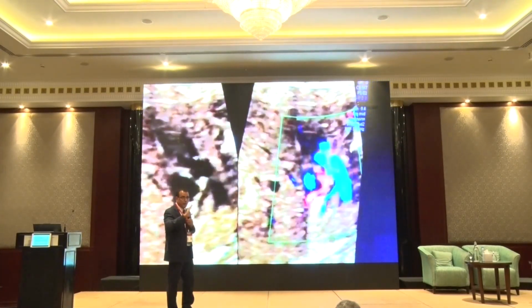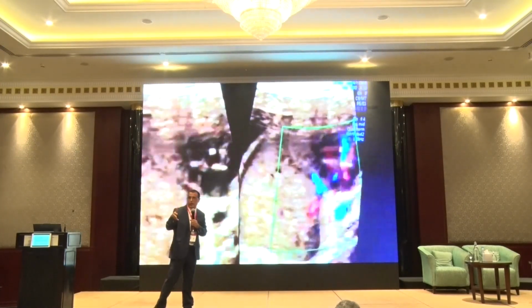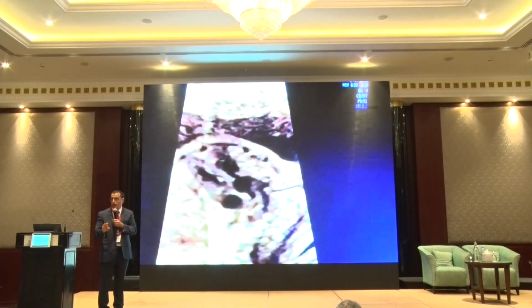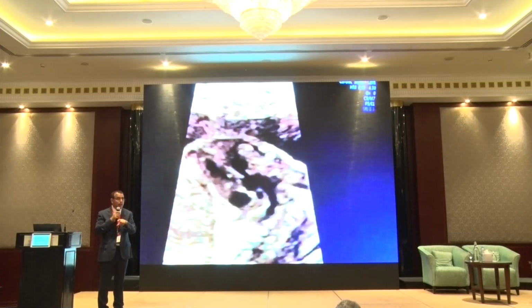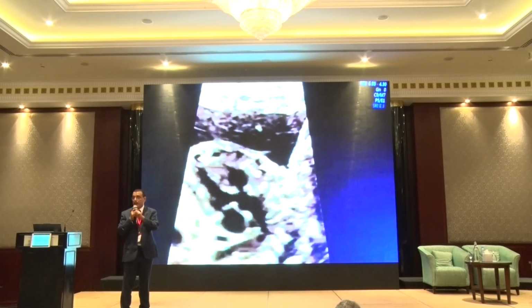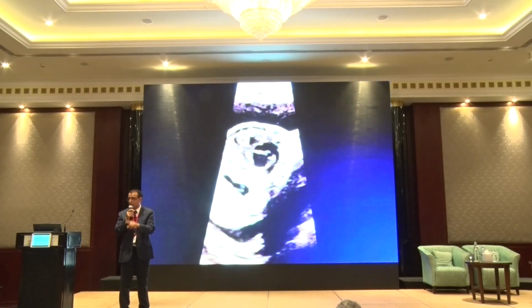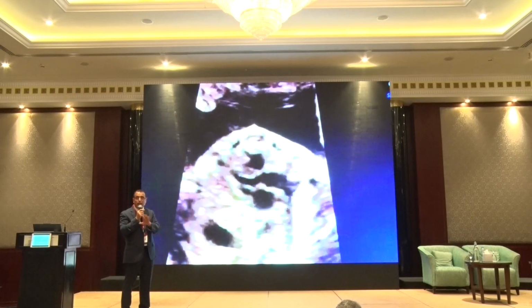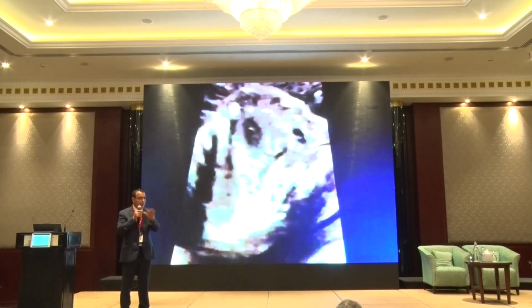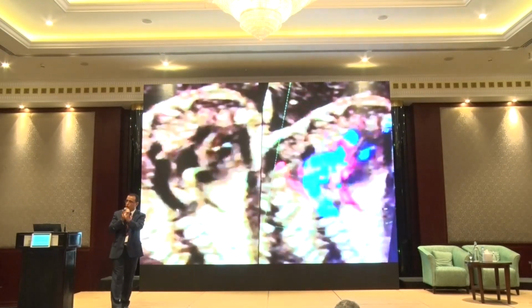Because the PDA will never give you branches for your head. It will only serve your pulmonary arteries. It will not go away. So you may miss the PDA, but you can never miss an arch. It could be a small arch, a disrupted arch, an interrupted arch. It could be anything, but you cannot say there is no arch. There is no such thing. So the arch is a very important comment.